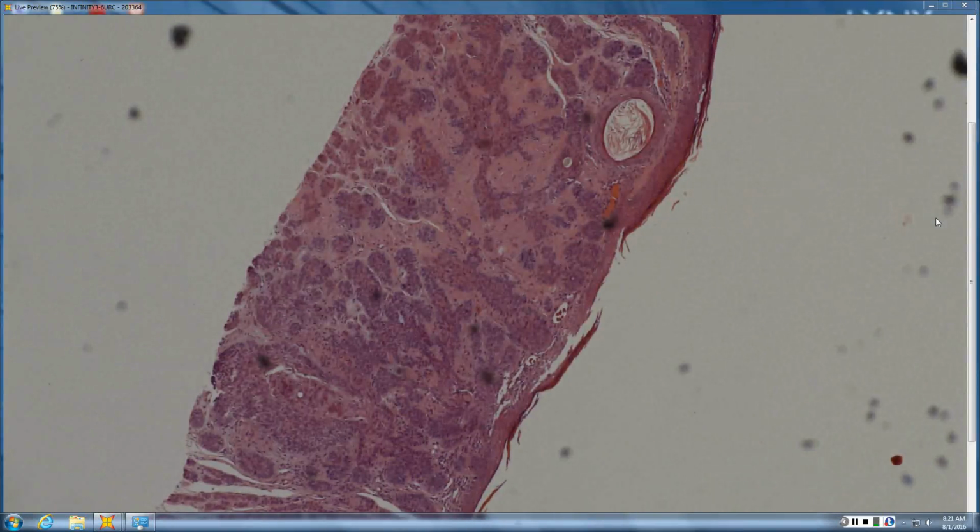And which one is this? I think it's the BCC. This is the BCC. Well, they both are types of BCC, I guess. So you were correct either way. Fibroepithelioma of Pinkus, the strands anastomose like a net with lumps of the stroma in between, whereas infundibulocystic BCC has finger-like projections rather than surrounding the stroma. They project out into the stroma.